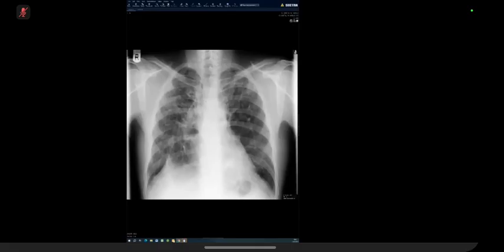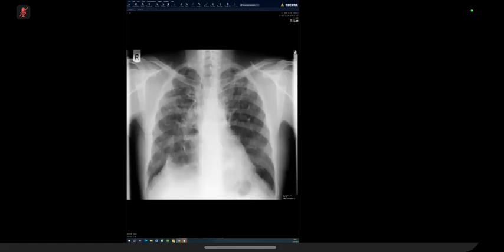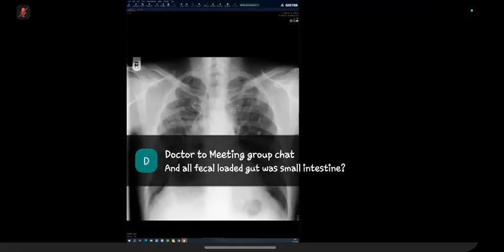So you said pneumoconiosis because of... tell me the reasons you've gone down. Because of the opacities in the bilateral mid and upper zones with a pattern of coalescing like conglomerate masses. Okay, I think you've jumped a bit there. You're right, there is upper to mid zone. Have you said the word fibrosis yet? Yes, ma'am. Yeah, so upper to mid zone fibrosis. So focus on describing that first so you can get all those points.